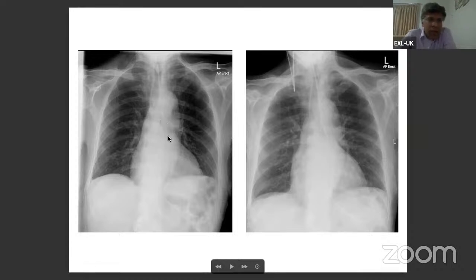If you see, this is a common problem that we often face, and I'll let Officer go through this X-ray with you later on. But you can see that this looks seemingly in the stomach, but it's actually going through the left border of the lung. And it's actually not in the stomach. So this is a common error that can happen. If in doubt, you withdraw, take it out, repeat it. That's what you got to do.